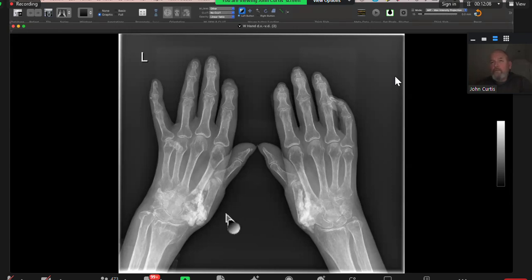It's very symmetrical and bilateral. And I can also appreciate that there is periarticular osteopenia noted along the wrist joint as well as in the metacarpophalangeal joints. There is some soft tissue calcification over here as well. Good. I can also appreciate acro-osteolysis, tuft resorption, noted along the index finger distal phalanx. Good. So keeping in view the acro-osteolysis and the soft tissue calcification, this could likely be a case of systemic sclerosis, scleroderma, and I would like to go further with investigations.